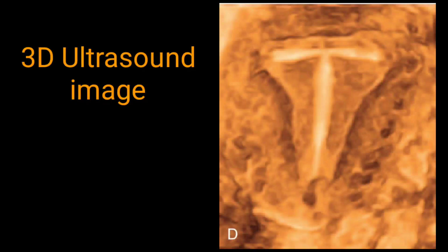then you can label the case as a low lying intrauterine contraceptive IUCD. If the IUCD is in the cervical area, then definitely it has gone down to a lower extent. So mention that uterine cavity is empty, intrauterine contraceptive device is seen in the cervical area. So these are the 2 methods you have to apply for the contraceptive devices. And if the intrauterine contraceptive device is not visible, advise X-ray pelvis to rule out any pelvic intrauterine contraceptive device.